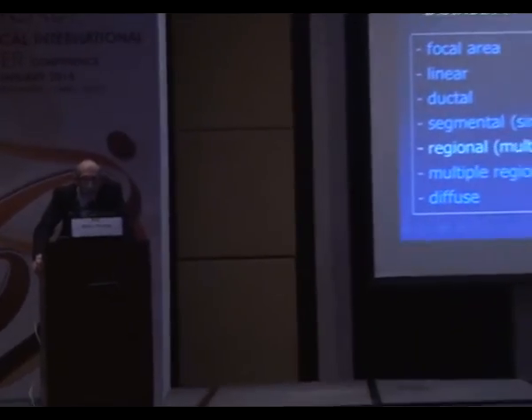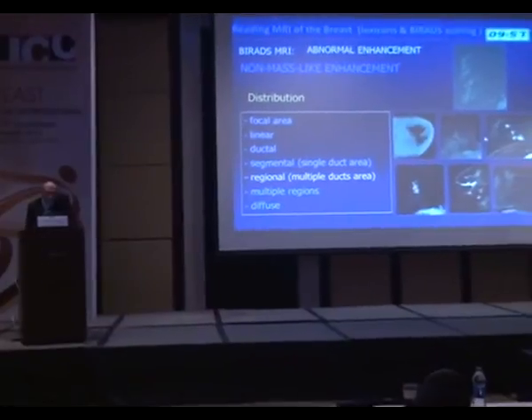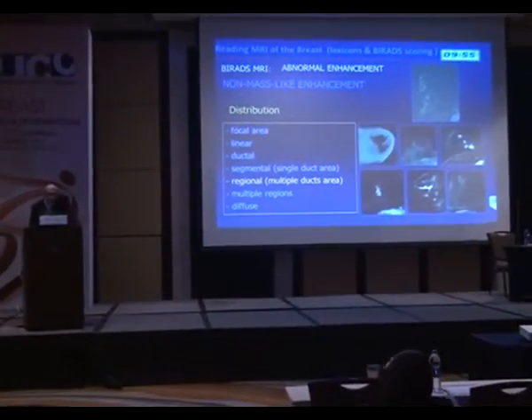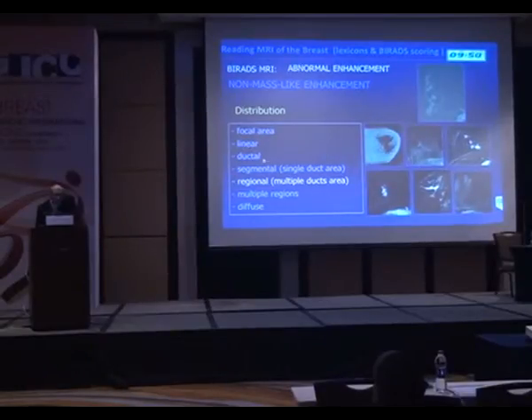Again, non-mass-like enhancement, so no 3D lesions, but lesions that don't occupy space. First of all we look at distribution: focal area, linear, ductal, segmental, regional, multiple regions, diffuse.